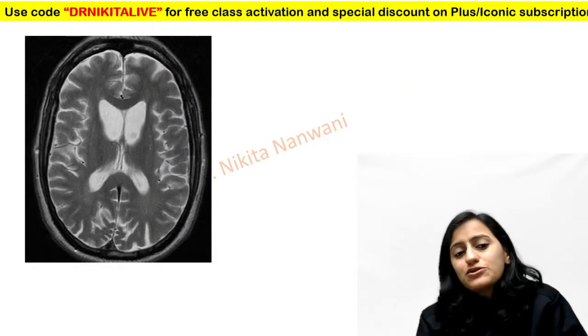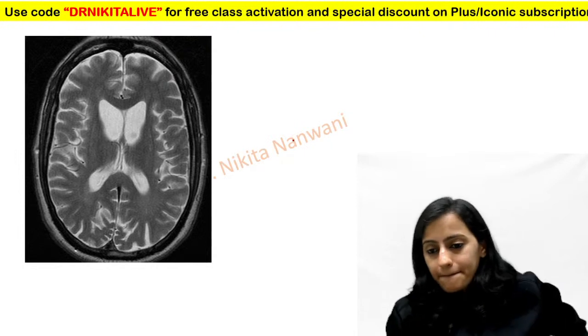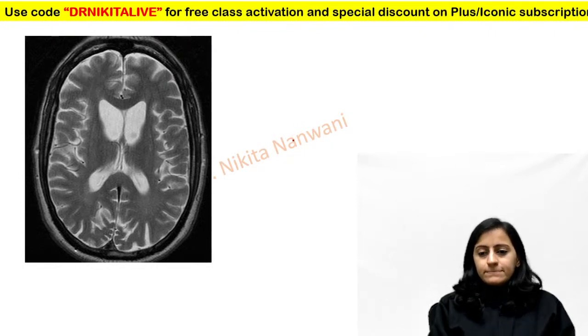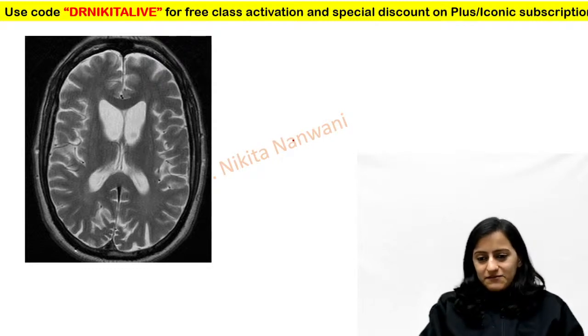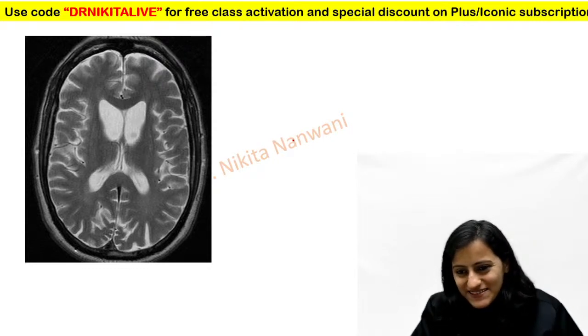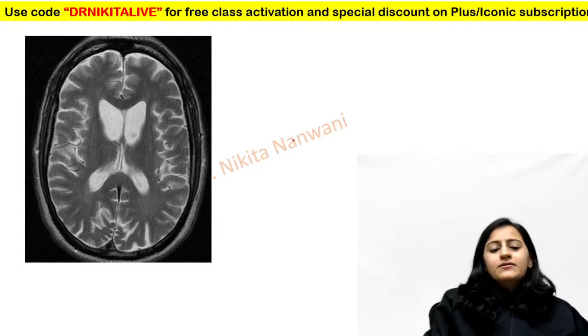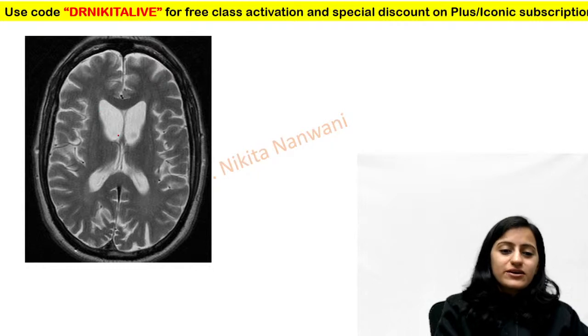Next one, what sign do you see here? Very good, Vivek. Absolutely right. What we see here is, look at the frontal horns of the lateral ventricles.